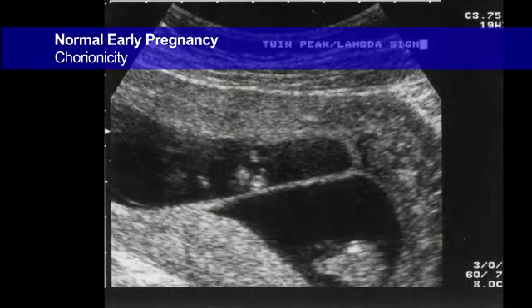In this slide you can see what's referred to as the twin peak sign, or the lambda sign, because of it resembling the Greek letter lambda. This shows a triangular projection of placental tissue from the chorionic surface, or twin peak, leading into a membrane dividing the two pregnancies on this slide.